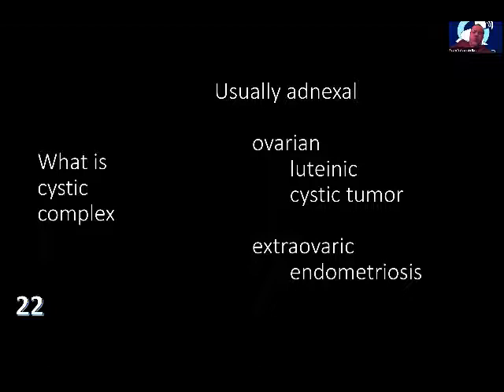Complex cysts are usually adnexal, either ovarian, which can be a cystic tumor, or a hemorrhagic thing like a corpus luteum or luteinic cyst.